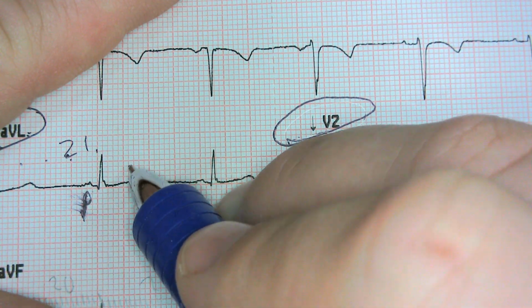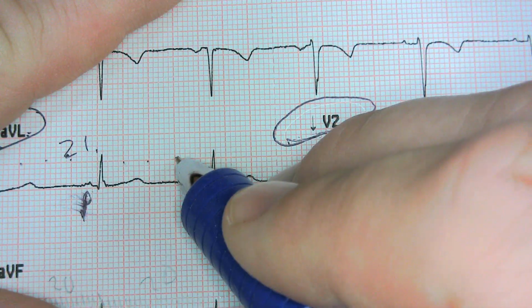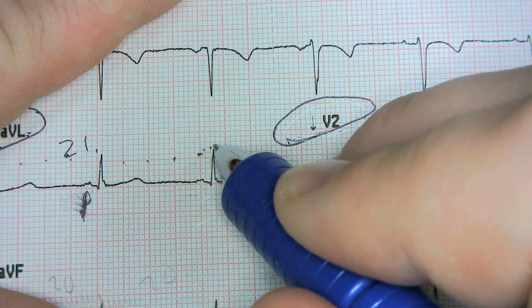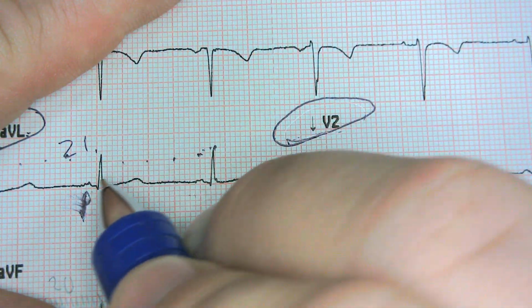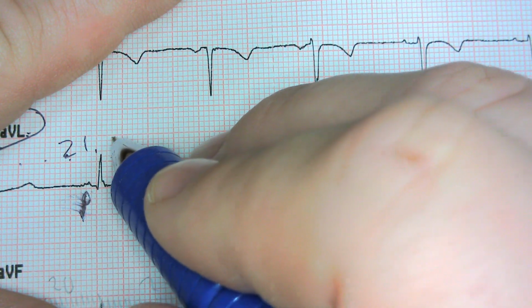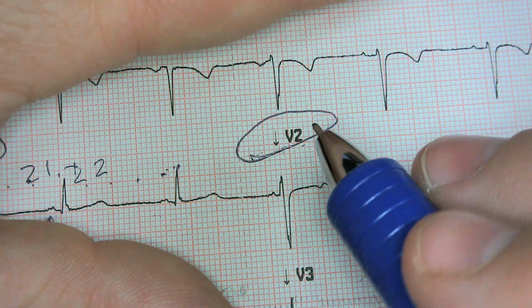All right. So we're going to start off at 0, just to make our life easy. 5, 10, 15, 16, 17. You could say 18. All right, we got 4 little boxes over here we didn't count. This is going to be 22, well within our 3-box range here.